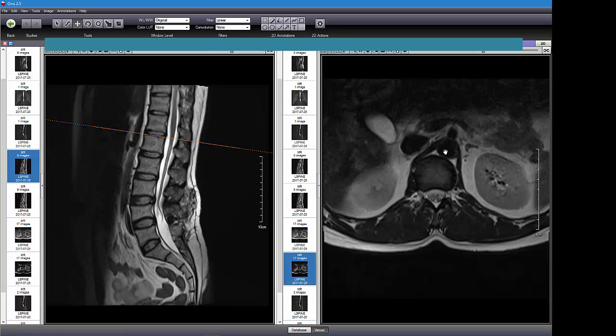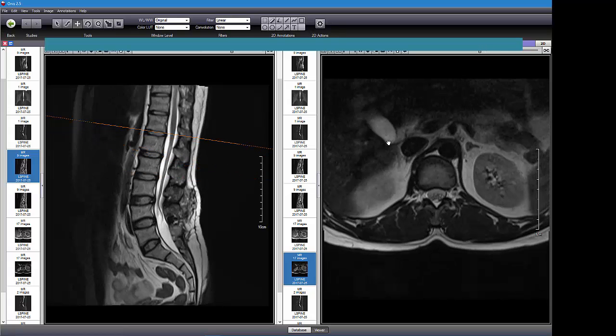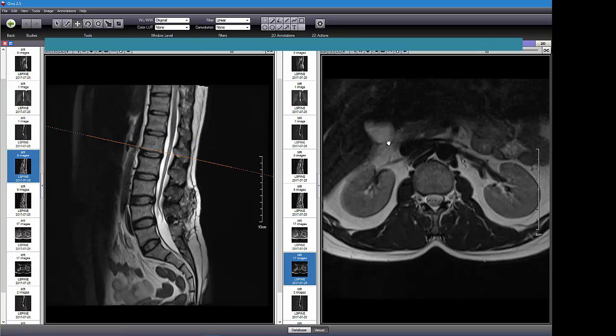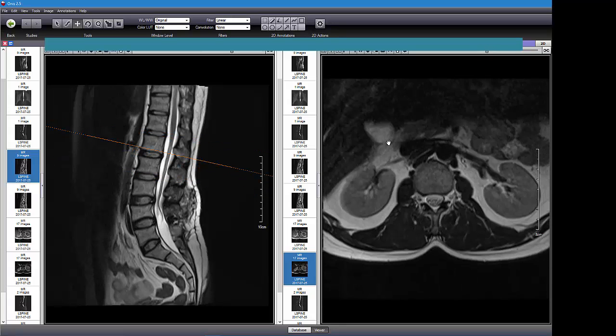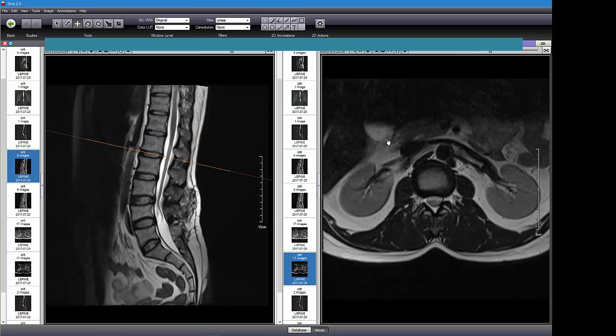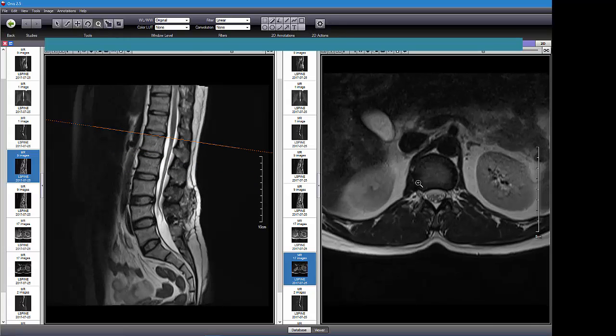Because there's the abdominal aorta right here, where the thoracic aorta is still up here. There's the vena cava right there. There's your kidneys, and I'm not sure. I don't usually see something like that there. I see kidney cysts all the time. It would be on the right side, close to the gallbladder, I wonder. Anyway, that's where radiologists shine. So I'm going to defer him to the radiology report. My expertise is in spine pain generators.